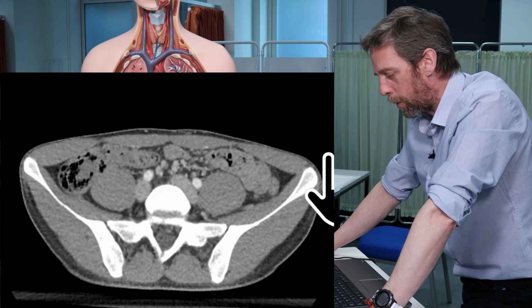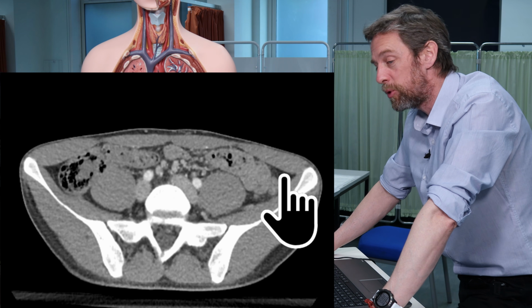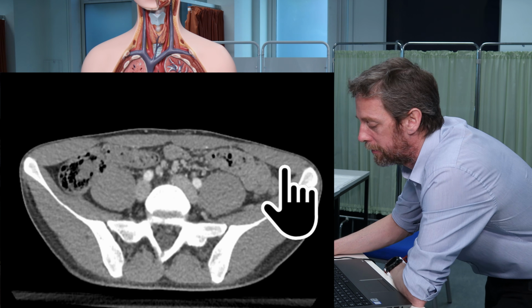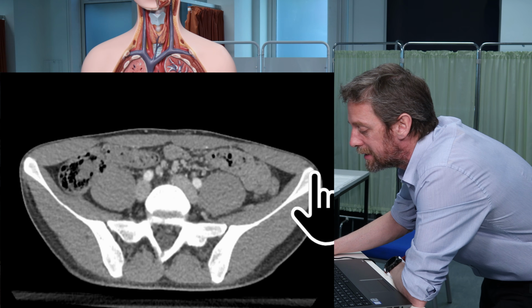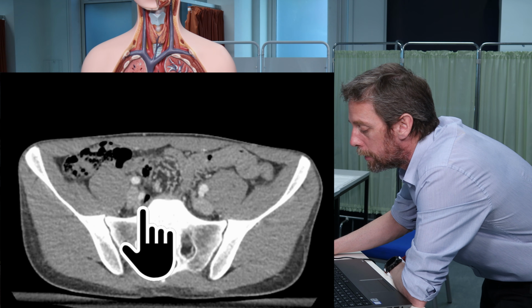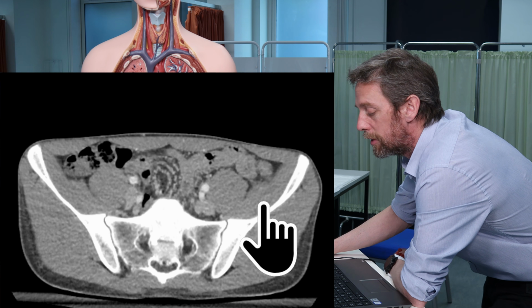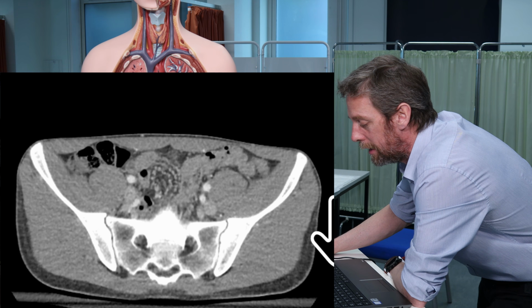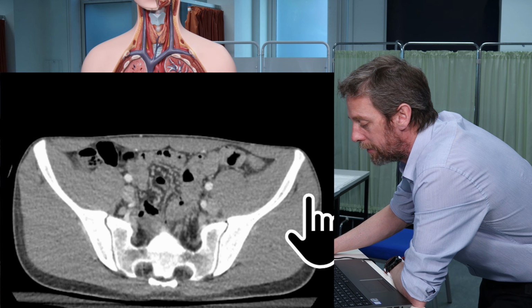Or we might think of it the other way around. Those are the two common iliac veins coming together to form the inferior vena cava, because we really should think about the direction of blood flow. But if I descend then, as I descend, we should see the common iliac veins separating into the internal and external iliac veins.